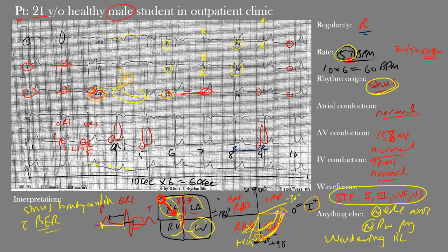So now just a few points on early repolarization before we close. Sometimes this can confuse people, so let's go over it. What you may find interesting in this early repolarization is that it really lacks a clear definition, because there's not been any defined criteria for upper limits of ST elevation in young males with this normal male pattern. So it's considered a normal male pattern.